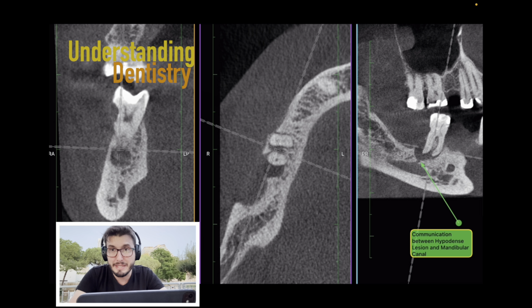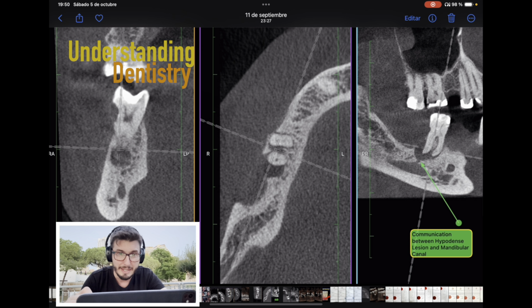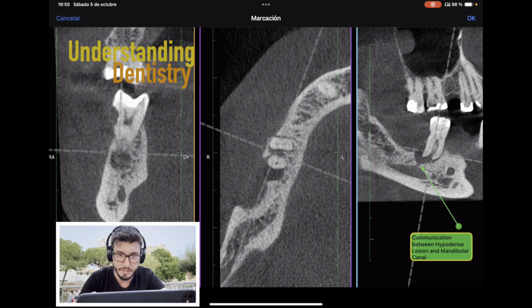We have a CBCT scan, and then we are going to discuss even clinical aspects, although we have only the CBCT scan here. All right, so let's see what we are seeing in this, which is the right side of the patient, and then of course you guys are realizing that we have some alterations here, right? Let's discuss a little bit about these alterations.